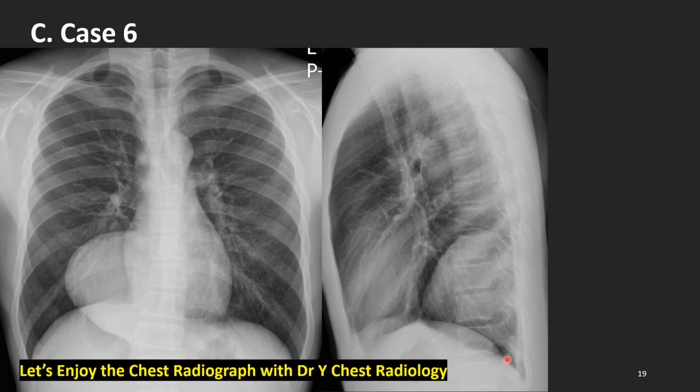That is the thoraco-abdominal sign. When this sign shows the mass is in a thoracic location like this, not in an abdominal location. The point is, what we see is only the highest point of the diaphragm.